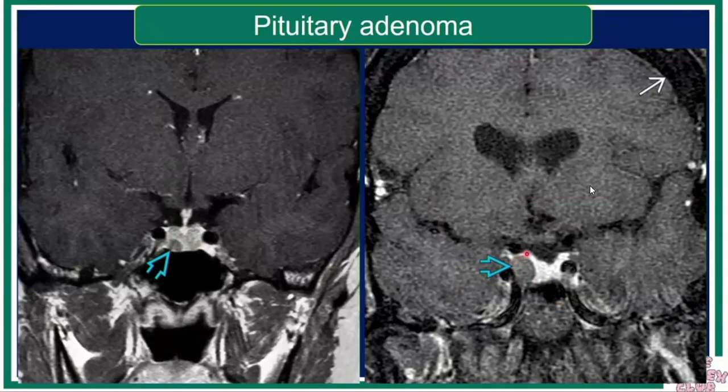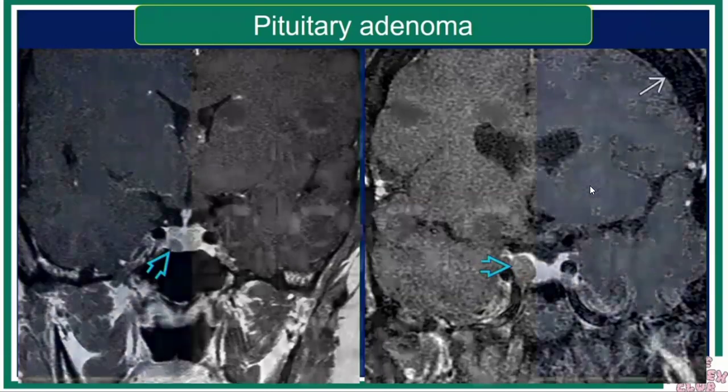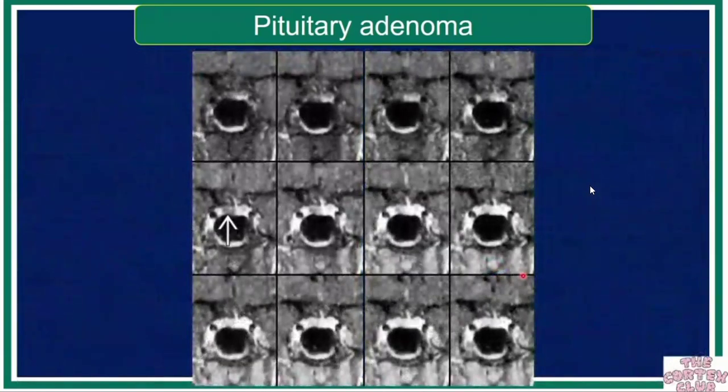And this is another pituitary microadenoma that is hypoenhancing and is within the substance of the pituitary gland. So these microadenomas can be commonly seen in patients who are presenting with endocrine abnormalities, most commonly prolactin abnormalities, with other Cushing's disease or thyroid abnormalities as well. And most of these can be seen with just the imaging that I described, T1 and T2 weighted imaging. But there is another technique that is commonly described for detection of these microadenomas, and that is a dynamic contrast enhanced MRI of the sella.